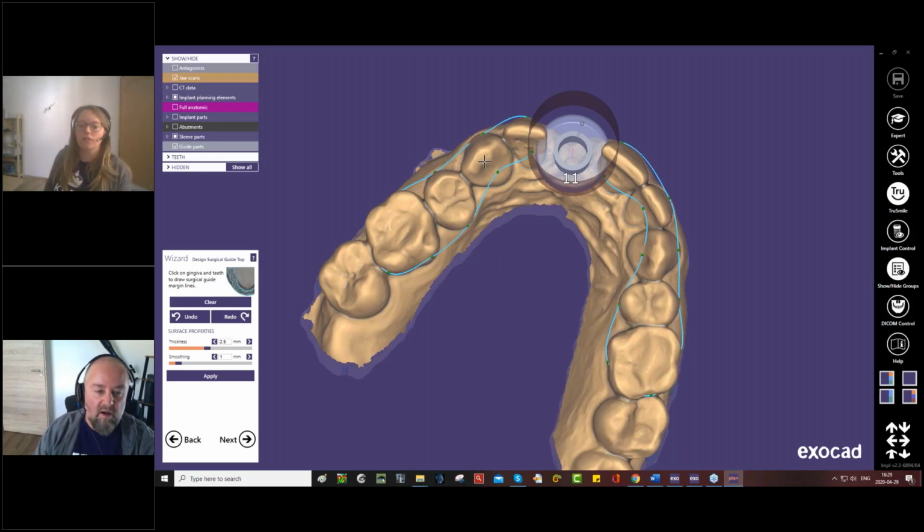So I guess that he's trying to do 2 guides because maybe implants are placed very closely together. You know what I mean? So that you first do drilling with one guide, and then you use the other guide because maybe one implant is directly next to the other one. That's my assumption as a reason for this. Yeah. In that case, he has to go through the step twice. So he doesn't have to go through all the steps, but you can plan. Let me think. No, you have to go through it twice.